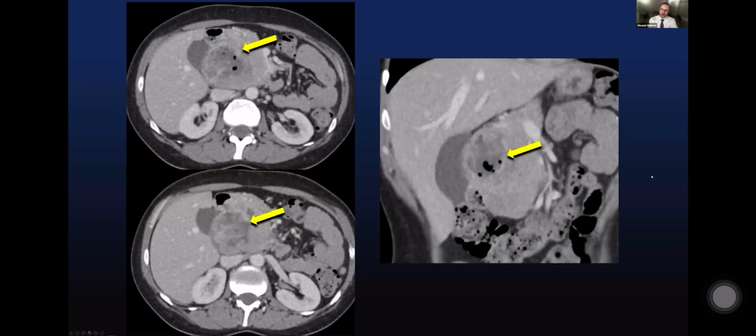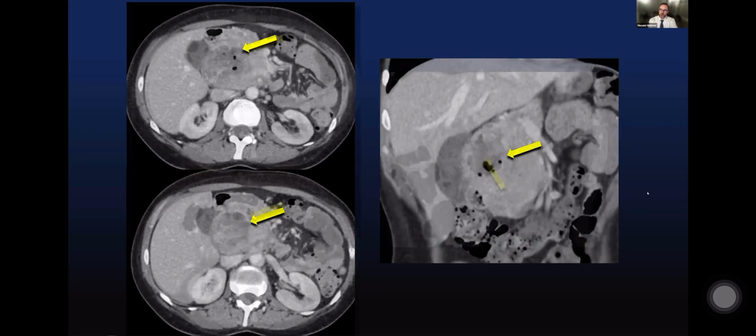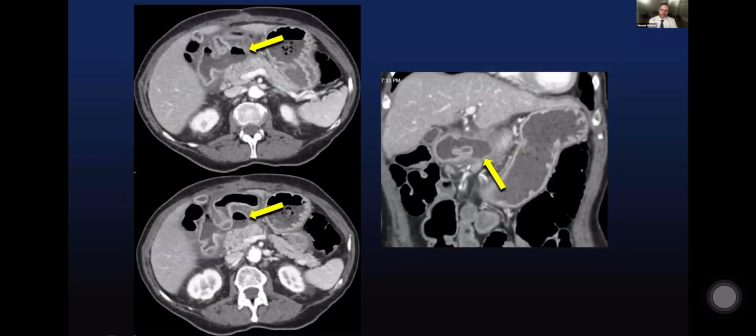Again, tumors are a good thing to keep in mind, not just in terms of having a sort of gray attenuation, or in this case, probably a little bit higher than gray attenuation, but also in terms of causing an abnormal small bowel contour. Contrast that last case with this one, very similar anatomic location, but a very different look.